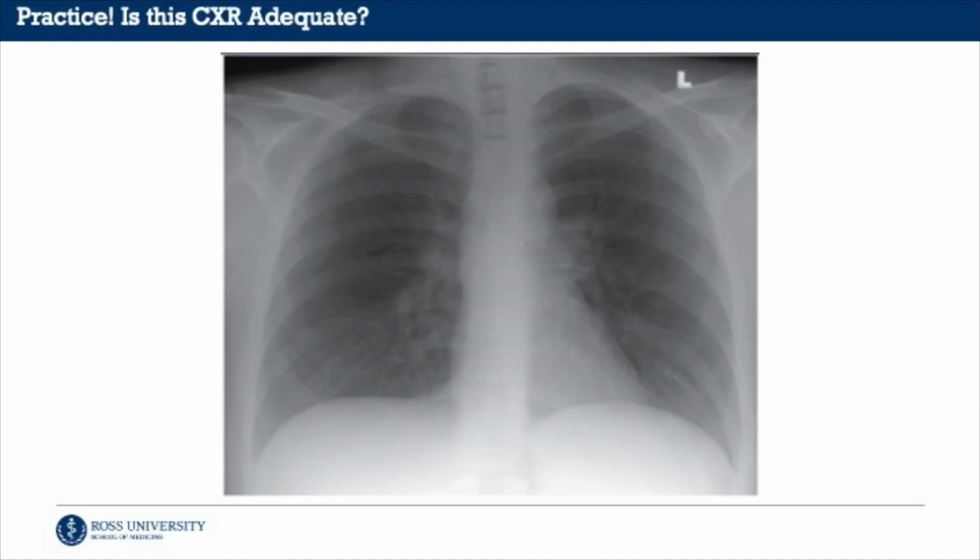Using the right mnemonic, determine if this chest X-ray is adequate. You can pause the video and take a few seconds if necessary. If after going through your right mnemonic, you determine that this was a physiologic normal chest X-ray, you are correct. Pat yourself on the back.